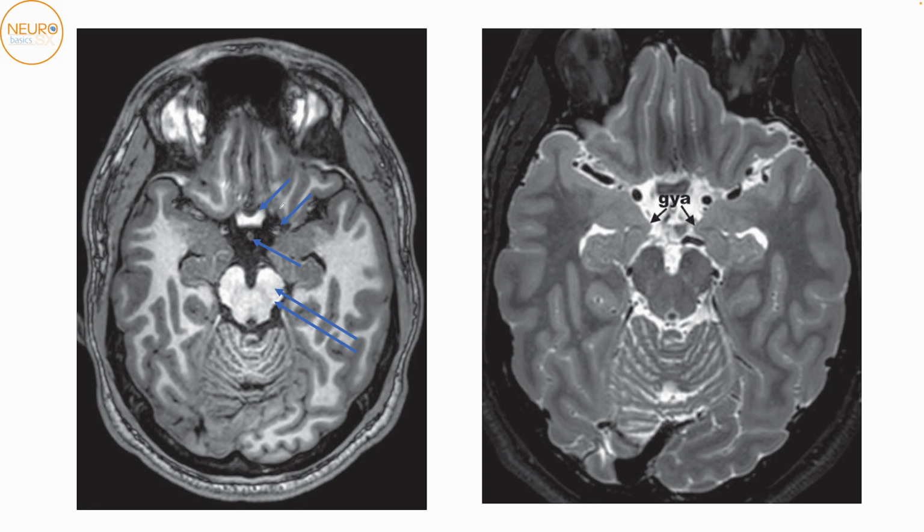Okay, coming one further cut down, we're able to see a few changes now. The midbrain is turning a little bit more into the shape of the pons. Apart from that, the optic tract, when it comes anteriorly, forms the optic chiasm and then the optic nerve. So we're able to see the optic nerves and the optic chiasm over here. Behind the optic chiasm, this very round, important structure is the infundibulum, forming the pituitary gland as it goes down.